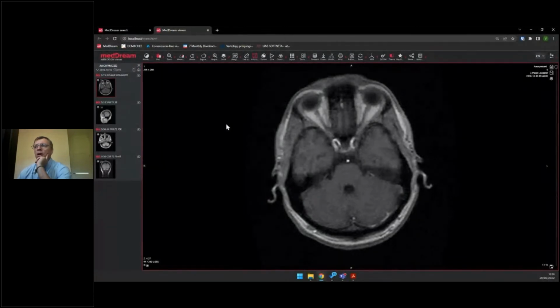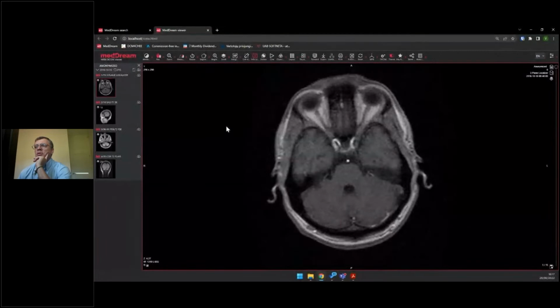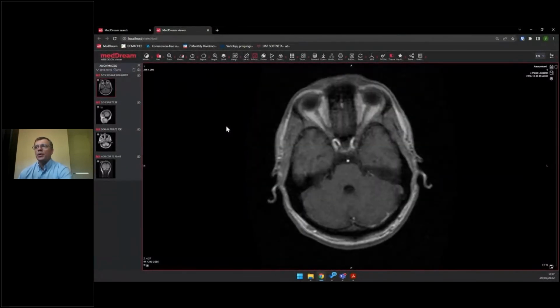So our users had a problem. Sometimes they liked to export data with annotations, and not in the DICOM format, but in some simple format like JPEG, PNG, or another format, which would allow a simple user to see the image with the comments. So what we did, as you see, we can now add any measurement or comment.